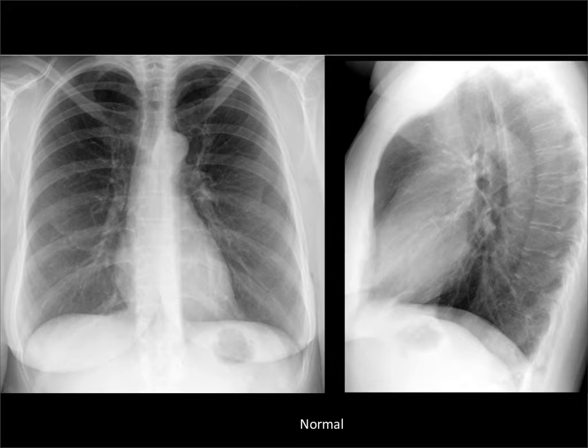And then our final chamber is going to be the left atrium. So the left atrium is the most posterior and the most cranial cardiac chamber. So it sits right in here, and we really only see the little left atrial appendage when it's normally sized. And then it's going to sit back here like this. So notice it is more cranial than the left ventricle. So when we're looking for enlargement, we're going to look for it to come back here.